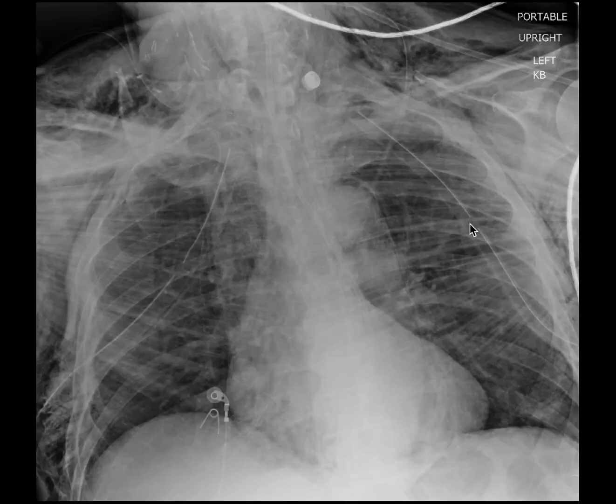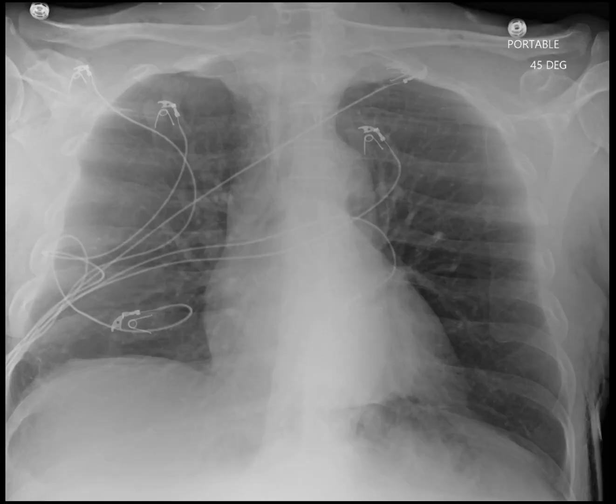This is fast forward to 1 week later. Watch this. Boom. Both chest tubes have been removed. The lungs are up, and they stayed up, and the tracheostomy tube was removed. The patient no longer needed it, and all that extensive subcutaneous emphysema has almost completely resolved. There are little bubbles here that are residual, but this is very, very impressive. This patient ended up doing very well. He was discharged home in excellent condition.